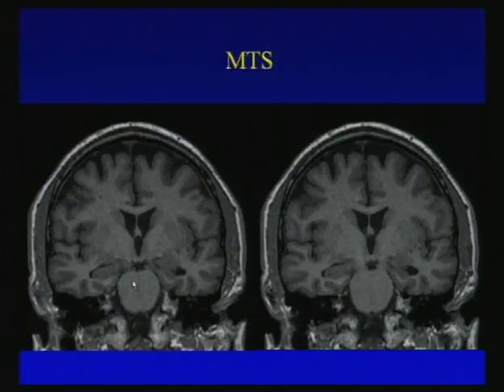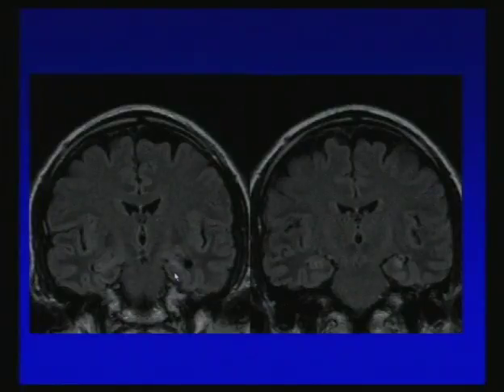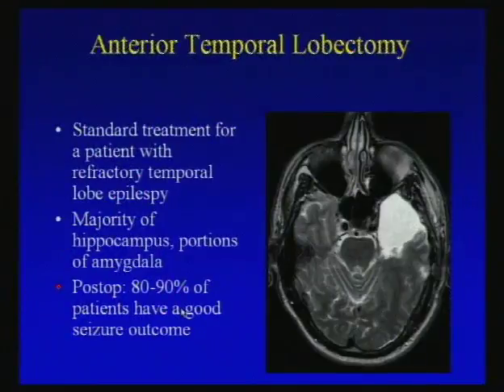If you look at the collateral white matter, which is the most medial white matter strip, on the right compared to the left, you see that the left collateral white matter is also atrophic. And on the T2 weighted images, we see what we expect to find: abnormal high signal intensity within the hippocampus, and the same is on the FLAIR images: abnormal high signal intensity, dilatation of the temporal horn.